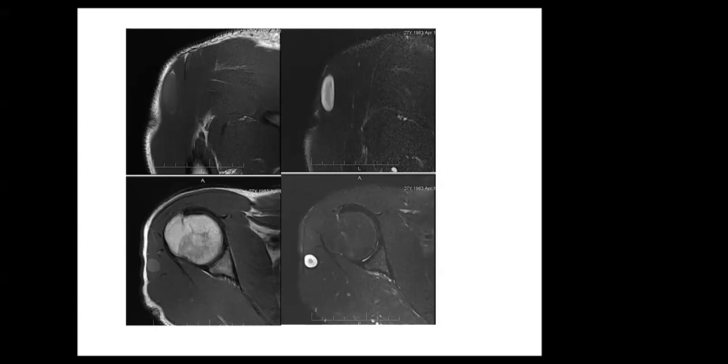There is a hyperintense mass-like lesion, well-defined, seen within the intramuscular compartment.